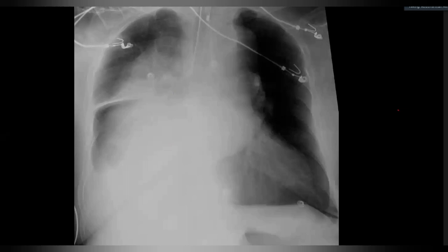Okay, I'm going to give you something because you asked me very nicely. But before I do that, is this patient well or unwell? The patient seems to be an ICU patient. Like he has leads. Very unwell patient. Okay. Yes, good pick up on the endotracheal tube.